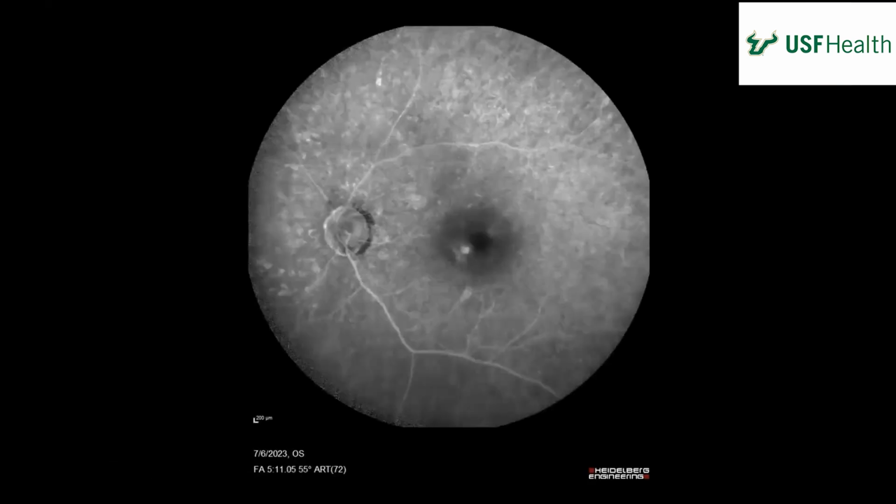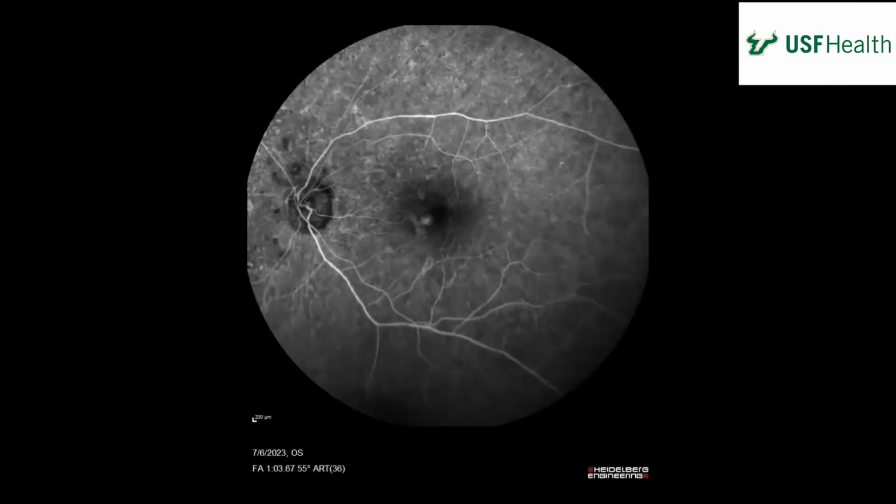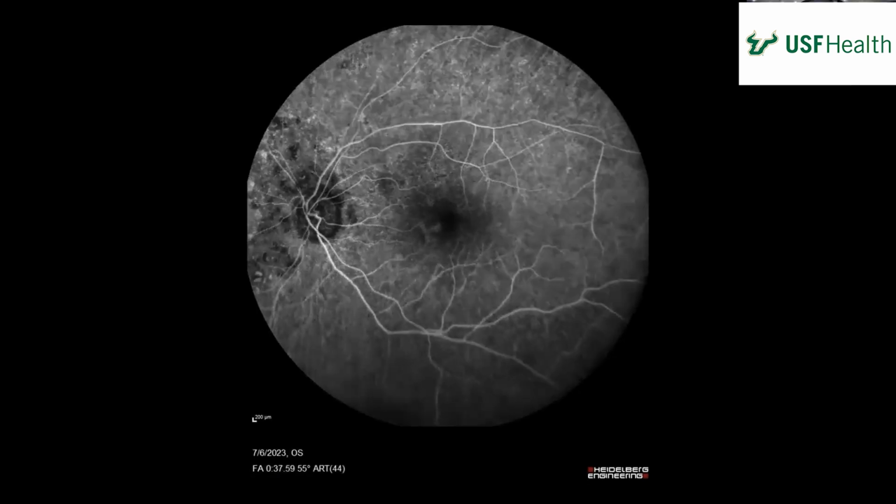And then this is essentially the end of this eye. Want to talk about what you can see? Yeah, especially around the nerve, there are areas of hypofluorescence that seem to remain the same size. And then there are also areas of hyperfluorescence that appear to enlarge over time with some blurred margins.